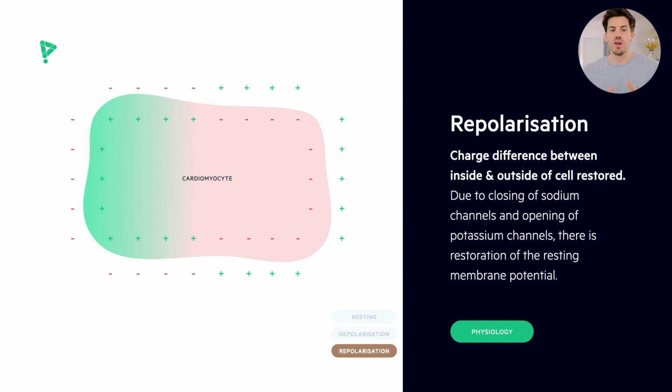Okay. So all the ECG essentially is doing is assessing these depolarization waves, and it's assessing these repolarization waves. And that's what we're seeing on the ECG. The different spikes, the different waveforms are essentially reflective of the depolarization waves and the repolarization waves. And one of the really founding concepts from repolarization and depolarization is the different deflections. And if you can understand this concept, it will help you really understand all of ECGs.